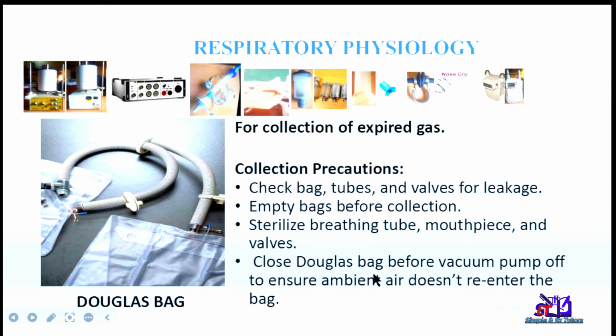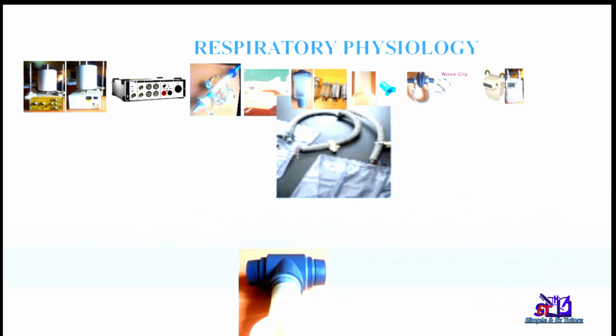There are precautions that need to be taken when using the Douglas bag. You check the bag, tubes and valve for any leakage and ensure you empty the bag before collection. Sterilize breathing tubes, mouthpiece, and valve as per laboratory procedures, and make sure you close the Douglas bag before the vacuum pump is off to ensure ambient air doesn't re-enter the bag. So those are some of the precautions that need to be taken into consideration.